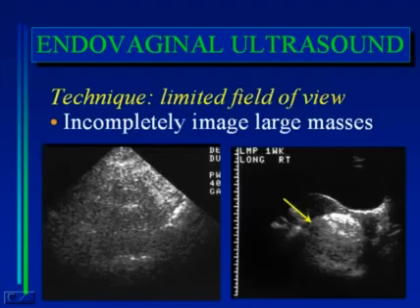So earlier in the lecture, we saw an example of a dermoid that could only be seen at endovaginal ultrasound, and now we've come full circle, and now we see an example of a dermoid that can only be seen at transabdominal ultrasound.